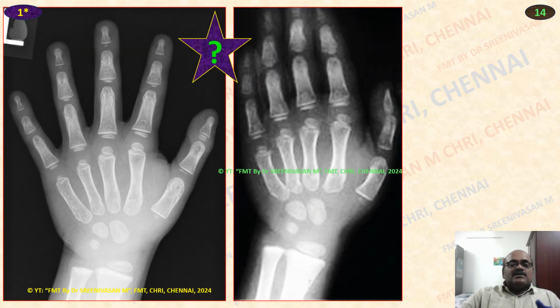In this X-ray, here 1, 2, 3 carpal bones are there. Triquetrum also formed. Capitate, hamate, triquetrum, lower radial head has formed, right? Base of the first metacarpal is seen here. Heads of second metacarpal, so above 2 years, above 3 years, but a lunate has not formed here, right? Adjacent to this triquetrum, the lunate bone is not there. It appears at 4 years. So age is between 3 to 4 years, we can say.